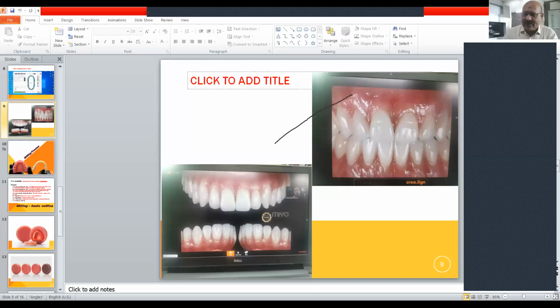We have a 4 implant case. We'll choose a model, the digital model, and proceed with the custom abutment design or maybe a bar design. Doctor, would you like to give any choice of first designing a bar for hybrid denture purpose or a custom abutment? You can make a choice and then I take the order accordingly.